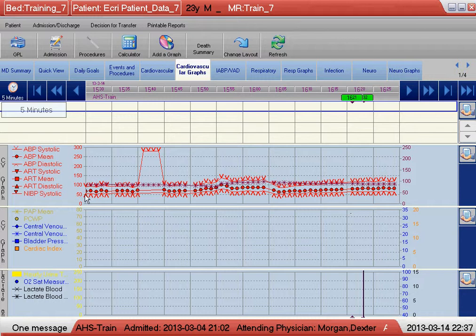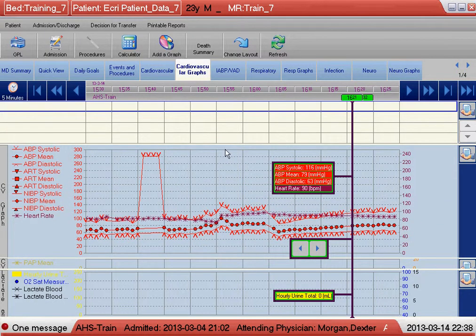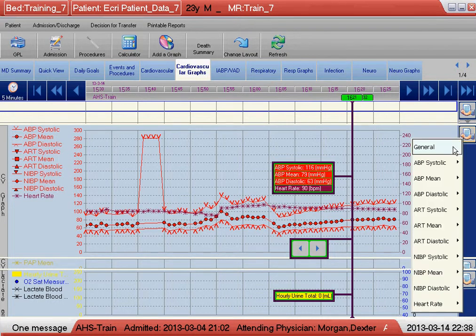And looking at the numbers there, there's an awful large range, from 0 to 300, and with the exception of this brief blip here, everything gets a little crunched down. So I'm going to modify the range on the graph in order to make it a little bit easier to read. I mean, you can simply pull the graphs down, which kind of helps, but it's kind of silly that you have a graph from 0 to 300 when you're only going to see a little bit from there.